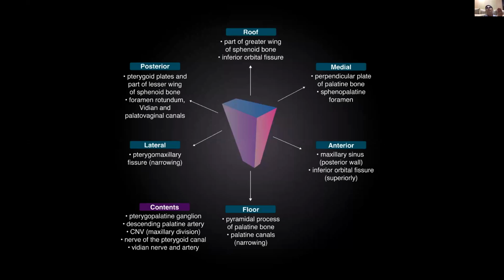These nerves can have perineural spread through hard palate disease. They can have disease spread through maxillary sinus malignancy. So this is one pathway for perineural spread along the maxillary division into the pterygopalatine fossa.